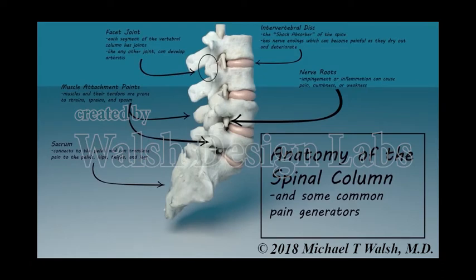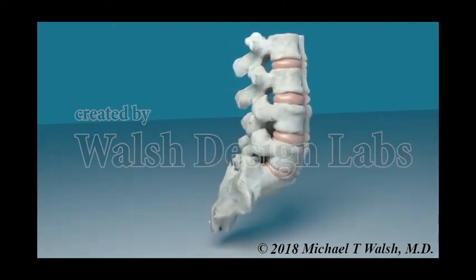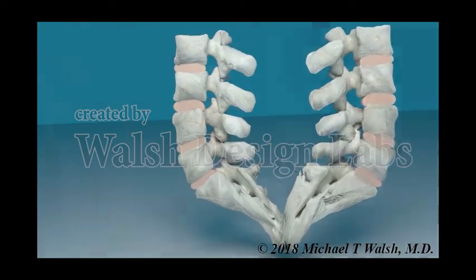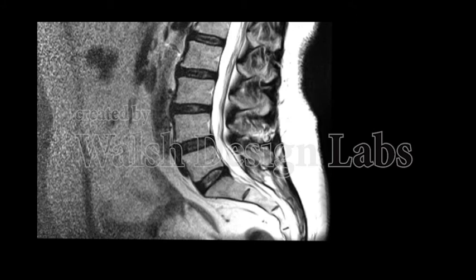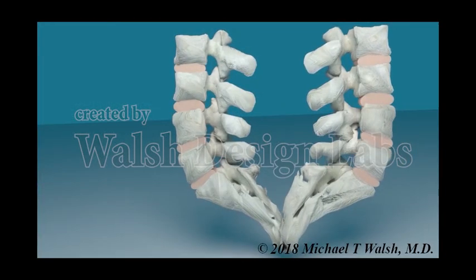Although an MRI is not a perfect representation of these, it does give some very useful information about the status of our spinal columns, as well as the spinal cord and the nerve roots. Now imagine that we could open up the spinal column as if it was a book and take a look at its contents inside. That's essentially what you have with the first MRI sequence that I like to look at. We call this the sagittal or side view of the MRI. I like to look at this because it gives a good overall sense of the alignment of the bones, the status of the intervertebral discs, as well as how open or narrowed the spinal canal has become.